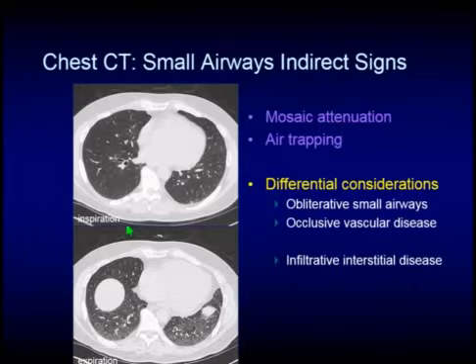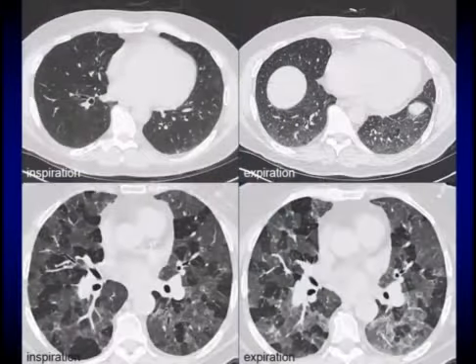And here we have a patient on inspiration and expiration, and so as the patient expires, the lung becomes grayer. And it becomes grayer with a dependent gradient, meaning that as you go to the more dependent area, it becomes grayer because of blood flow. And you may have small areas of air trapping, but notice that, again, it's not really very profound, certainly not any more than about 25% of a lobe or even on that one cut, and certainly not a lot of air trapping in the non-dependent lung.